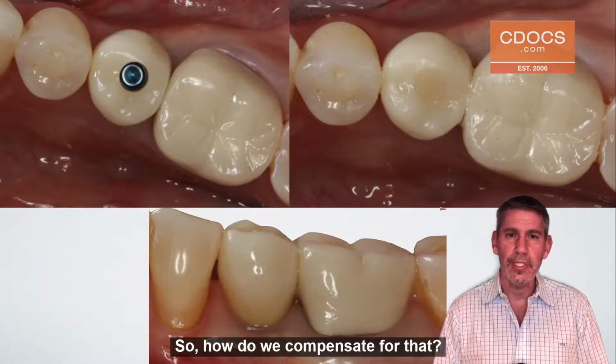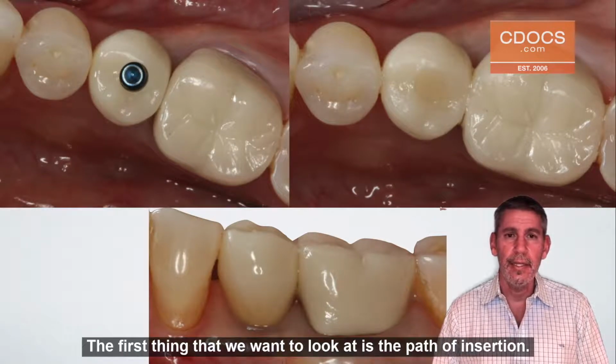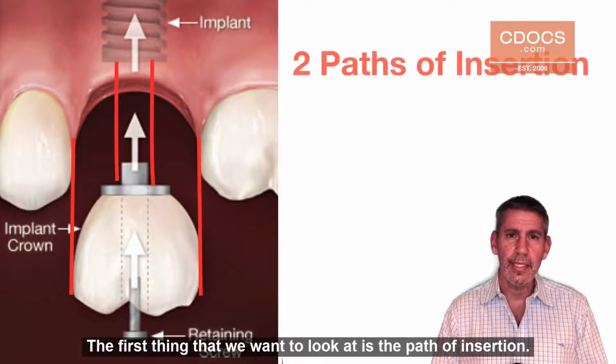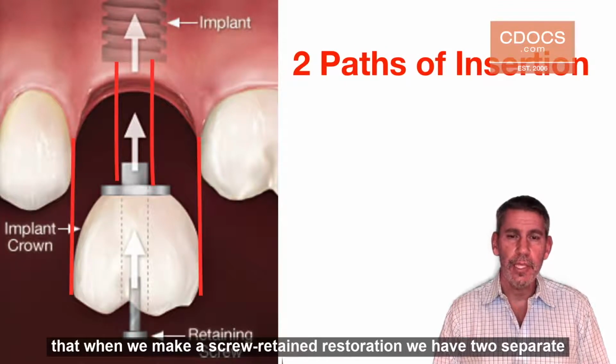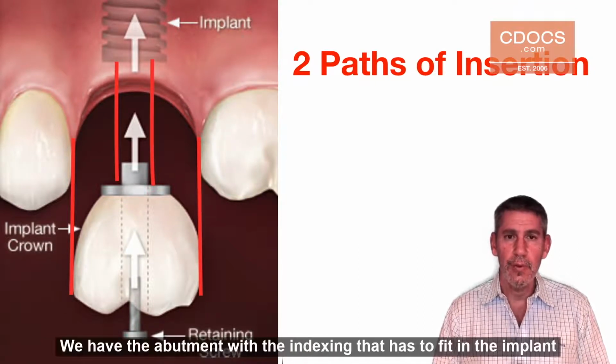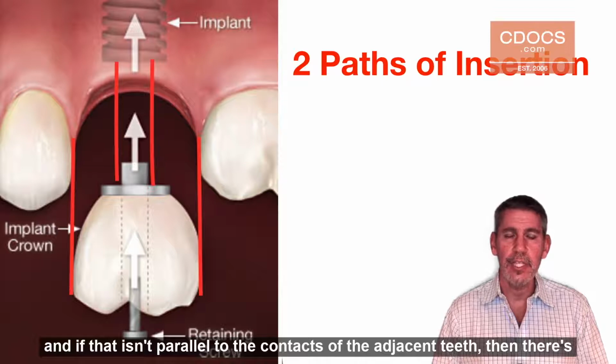So how do we compensate for that? How do we figure out ways to avoid that? The first thing that we want to look at is the path of insertion, and it's really important to understand that when we make a screw-retained restoration, we have two separate paths of insertion. We have the abutment with the indexing that has to fit in the implant, and if that isn't parallel to the contacts of the adjacent teeth, then there's no way this is going to seat.